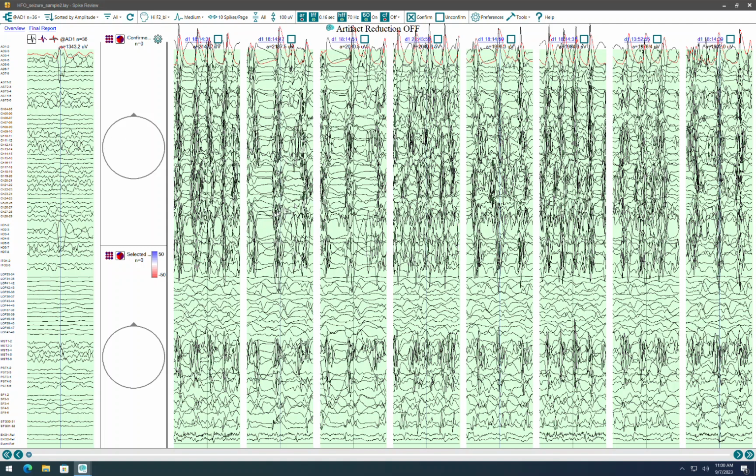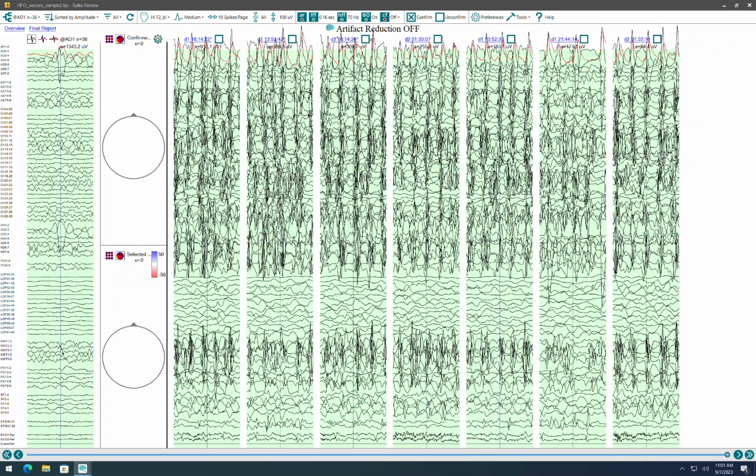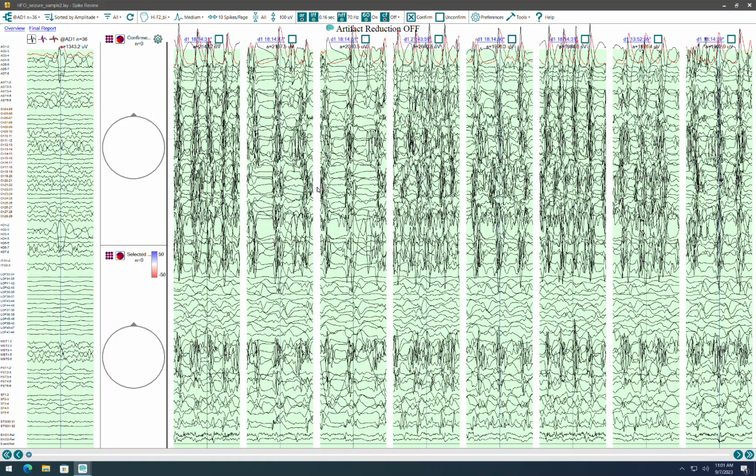Now these seizures are all continuous spike, so it's picking those up within those seizures. And the old reveal algorithm, which this is, does not attempt to mark all the spikes within a spike burst. It'll mark some subset of those. The current spike detection for the scalp product, or the scalp algorithm, does do that. So just keep in mind, if you're doing spike counting in an intracranial, this is really primarily optimized for interictal as opposed to ictal. But it will mark them within an ictal burst. It just won't mark all of them.